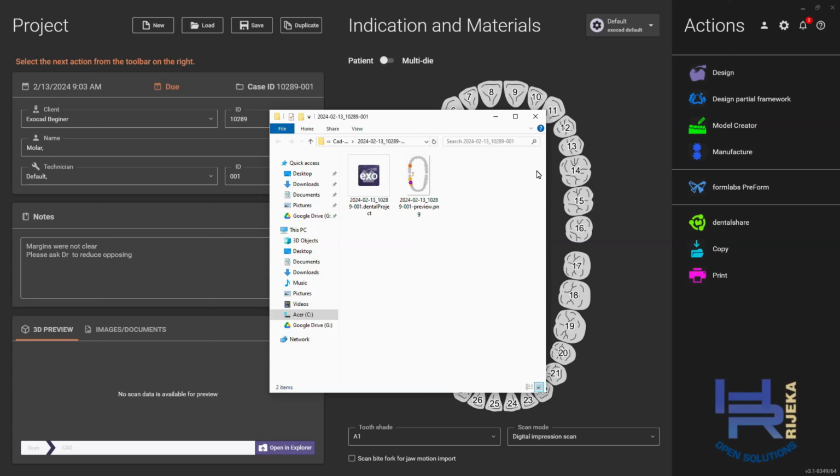So there is a folder called CAD data, and that is exactly where all of the patient and project files are stored. The ones that we create, the project creation files, are always stored in the CAD data folder. Then it creates a number using the date and just an ID number, the case number. And then within that, that's where we want to drop in any information we have. For example, if we're making a smile design, you would want to have your smile picture in here just to have quick access. If you have a wax up scan, you want to add it in here, your STLs, your upper, your lowers, etc.